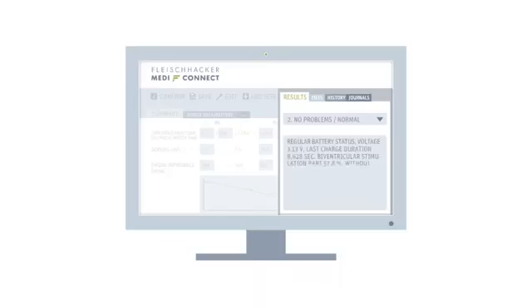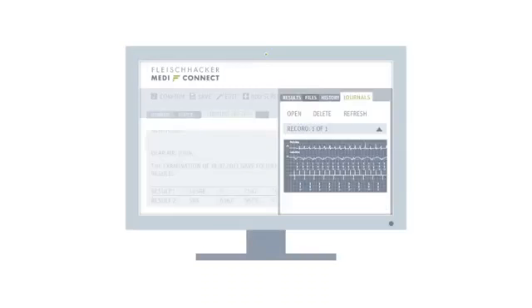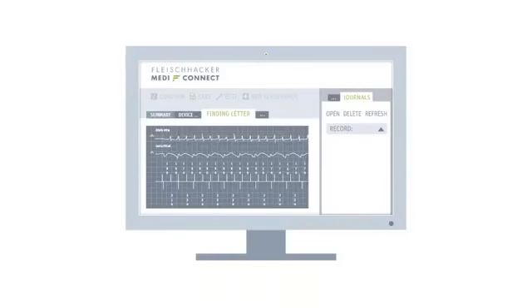In the Comments field, directly below, the user can enter additional text or select one of the text templates with a right mouse click. In the Journals tab, users can save screenshots, for example from EGMs. A screenshot can be added by clicking Add Screenshot.